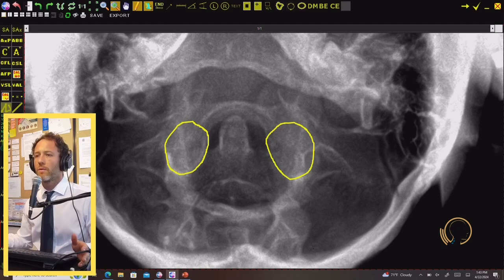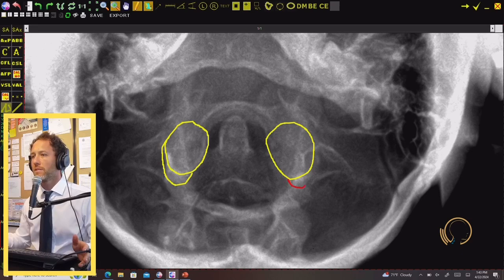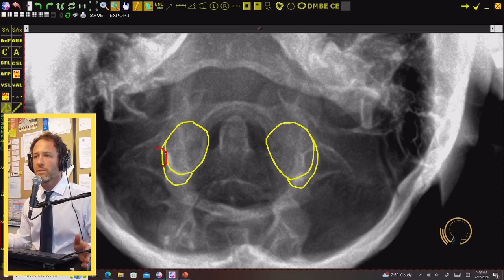And then for that superior mass, it's actually going to be just underneath. I think you'll see this, right? And it can even go a little further lateral before kind of intersecting there. And same thing underneath on the other side, it'll be a little bit south. All right, so inferior facet, inferior facet, and superior, superior. Okay, so transverse foramen, just marking these out for you guys. This one's pretty straightforward for most of us. We're used to these guys.